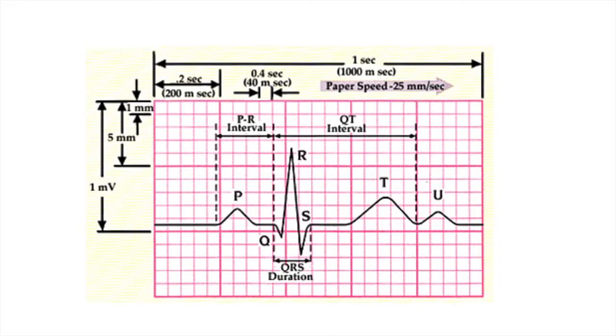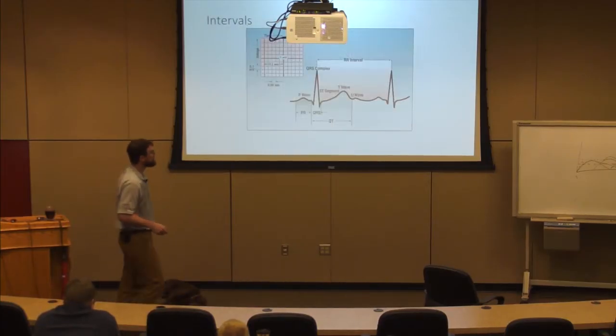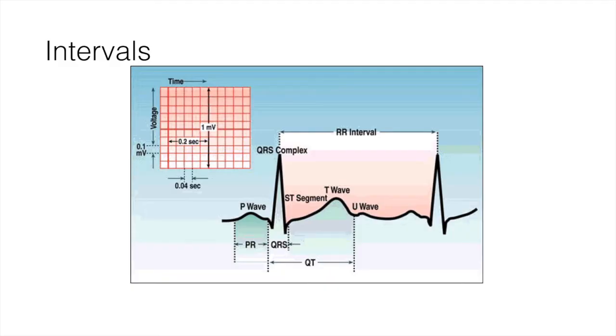And then this QT interval really should be within 2 big boxes. But sometimes with QT, it's easier to say, I'm going to keep it half of the distance between one beat to the next beat, okay? So I say my QT interval needs to be half of the distance of my RR interval. And that's a quick way to eyeball it, to say I know that QT looks long or that QT looks appropriate.